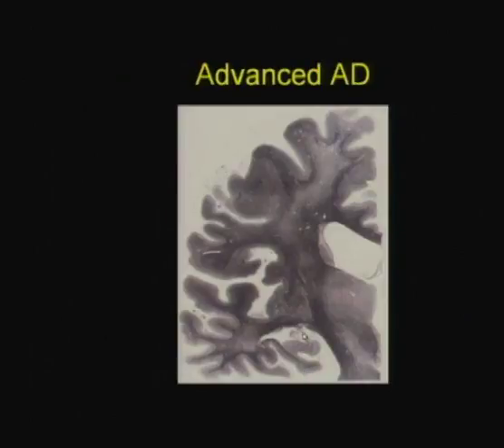And here's an advanced Alzheimer patient at pathology showing this is a very advanced degree of atrophy. This is not likely something you're going to see on an imaging scan because the patient is not cooperative enough to be scanned. You notice the shrunken hippocampus, the parahippocampal gyrus, and the rest of the temporal lobe gyri are mere slivers. And then the disease has progressed into the parietal phase, and from there on to the rest of the brain.